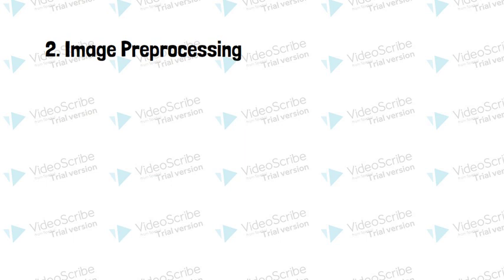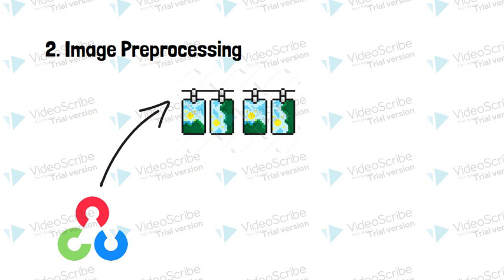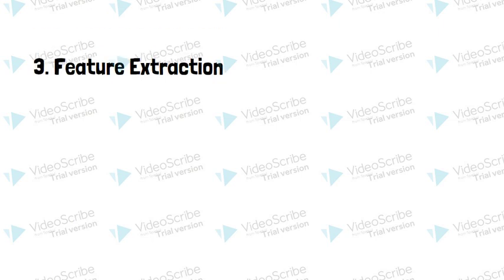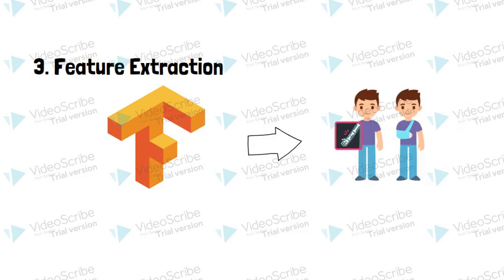Once the X-ray image is uploaded, we use OpenCV to pre-process the image, removing white noise and enhancing its quality to ensure accurate analysis. Next, we move to feature extraction using TensorFlow. Our AI model detects the anomaly, determines its location, assesses the severity, and measures the size of the fracture.